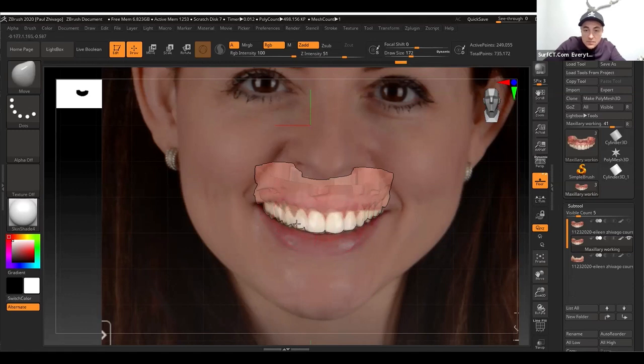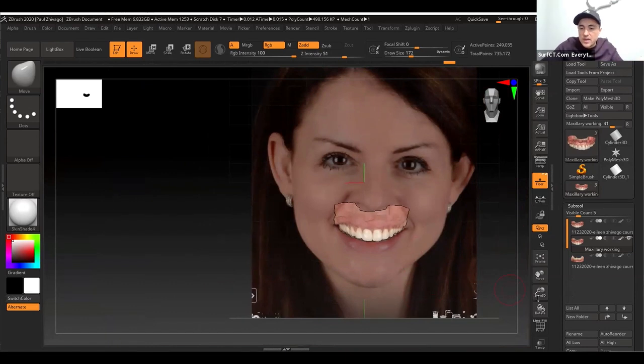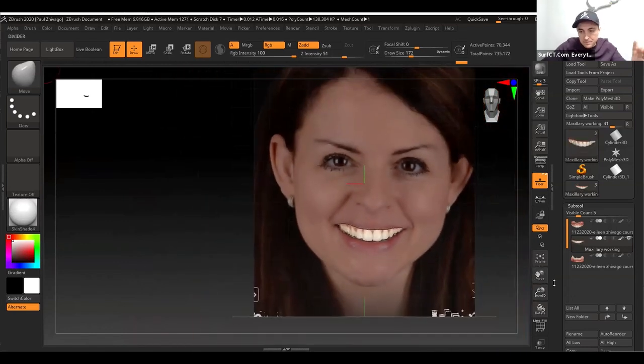And you can refine this exactly the way we did before, just with the difference that now you're working with the grid in the background, and you can be way more precise by using this grid. And then once you're done, you again control shift, see the result, and see if this is really something that you like to print out and present to the patient. So that is one way of working with it.